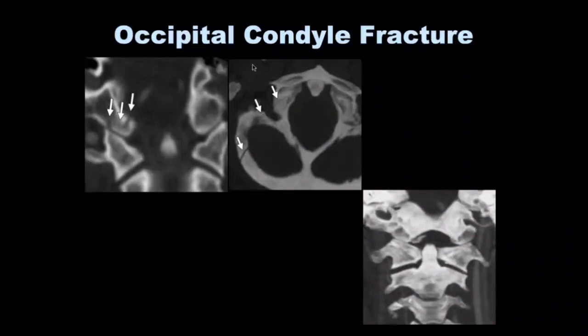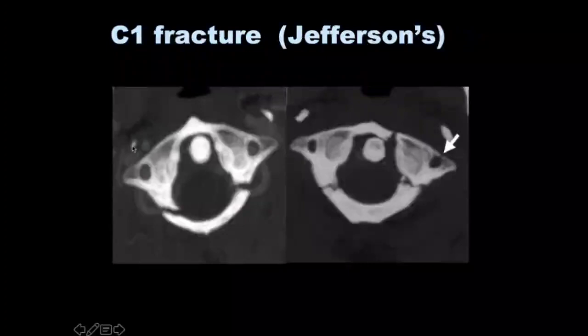Usually you'll have both the brain and the cervical spine to report together. But if you're having any investigation in isolation, just make sure that you cover the base, so to say. And that's extending into the occipital condyle C1 articulation as well. That makes it an unstable injury.